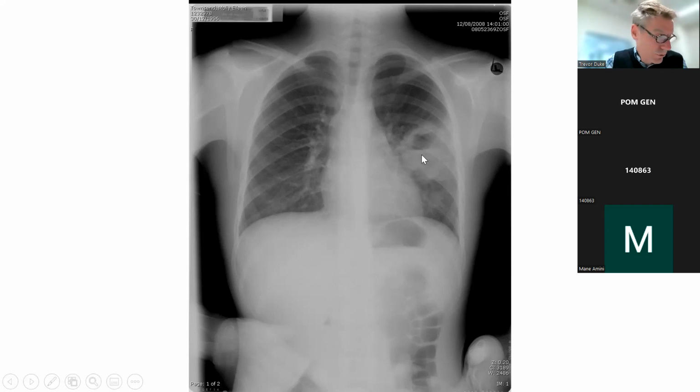And what could that be due to? What things are running through your mind when you see this? You should start thinking about, well, what next? What could it be due to? What bacteria or what bugs could be causing this? Yes, staph infection. Yeah, that's right. It could be a staph infection. What's staph, Benji? Staph aureus. Yes, most likely Staph aureus, because that produces abscesses within the lungs. Anything else it could be? What else could cause a lung abscess?